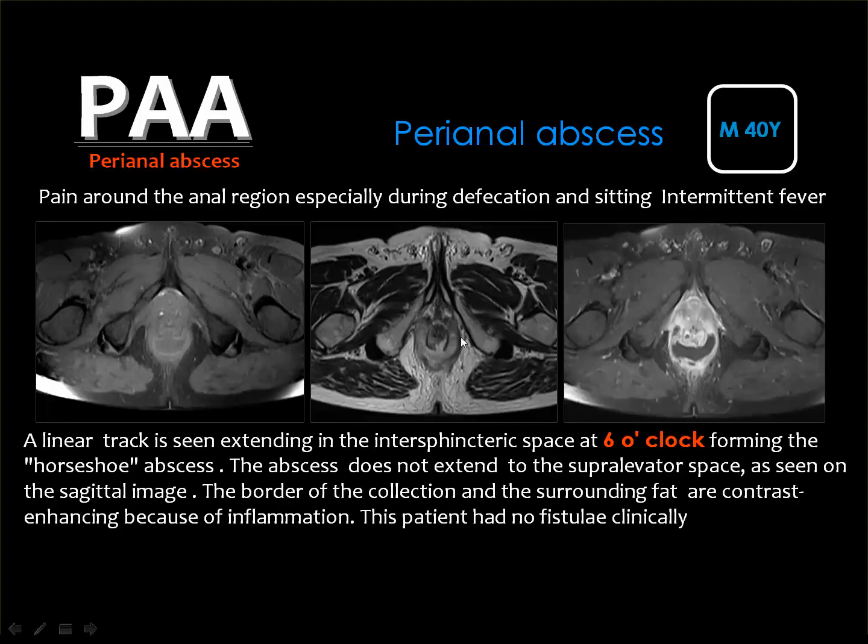of, you should know that anal abscesses may be associated with fistula and may not be associated with fistula, and here you have only an abscess which is located in the intersphincteric area, and you can see the opening of the abscess into the anal canal, but this patient had no fistulous opening externally. This is the T1 with fat suppression, and you see the relative high signal of the wall, and if you inject contrast material, you see the enhancement of the wall as well as the extensive inflammatory changes.